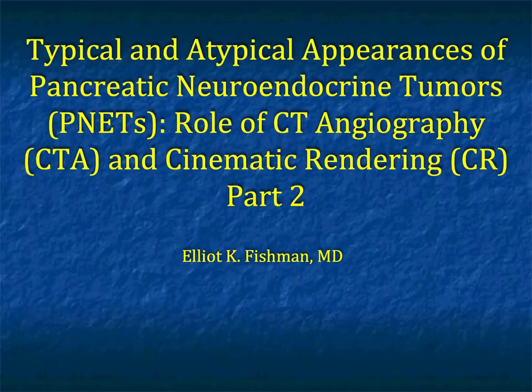Hi, this is Elliot Fishman, and welcome to part 2 of our talk on typical and atypical appearances of neuroendocrine tumors, the role of CTA, and cinematic rendering. In the first part of the study, I went through a number of different points with you about the appearances of neuroendocrine tumors, how most of them are vascular, but they can be hypovascular as well. They can contain calcifications. If they're critically located, they can obstruct the pancreatic duct and very much simulate an adenocarcinoma.